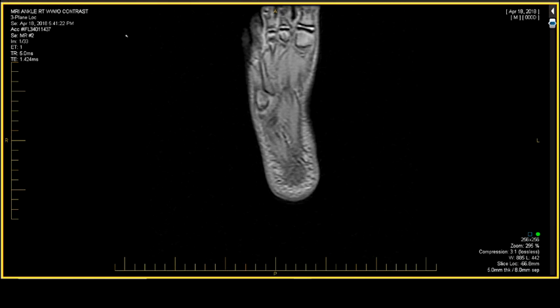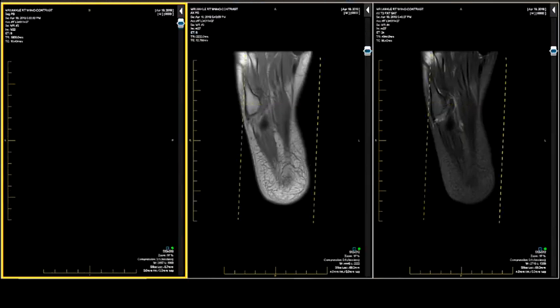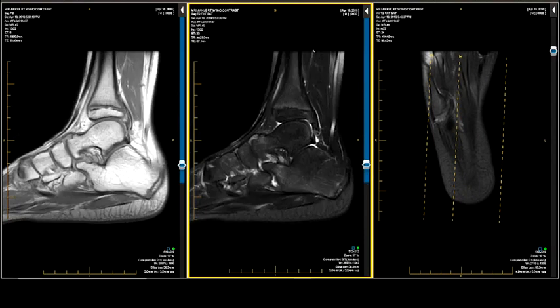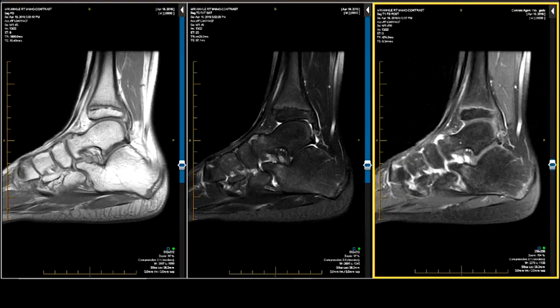An 11-year-old, evaluate for synovitis. This will be a quick one. Let's just see what that looks like. We saw RSD, remember? Peripheral edema.